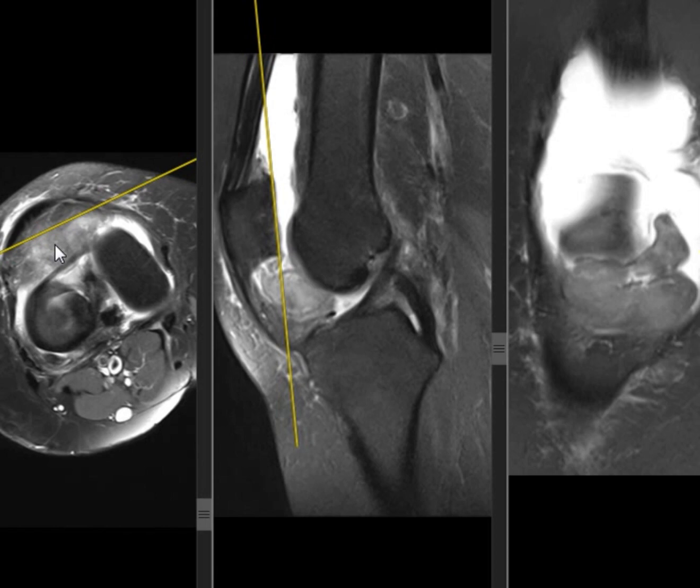It's an open question. Differential? Synovitis. By name, itis means inflammation. So, does this look like inflammation? It's clear surrounding, no surrounding edema, just a lesion sitting there. What about synovial hemangioma? Is it a possibility?